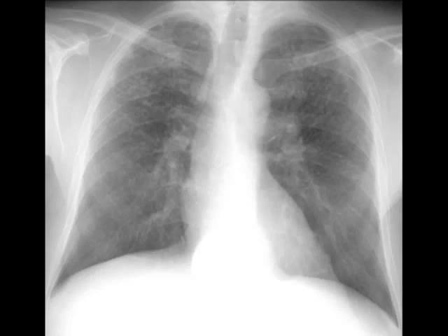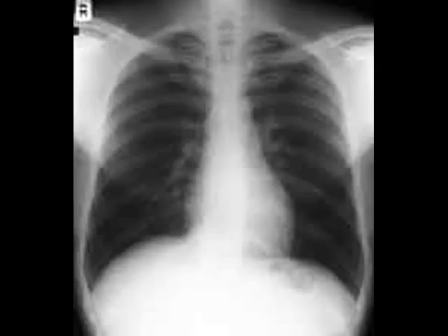The last indicator of quality is exposure. Now this is the hardest to illustrate and the hardest to see, but I'll do my best to explain it. Underexposure is an x-ray that doesn't reveal enough information. The x-ray appears too white because not enough energy was used to shoot the x-ray. There are calculations used by the x-ray technician to determine how much energy to use. In an overexposed or over-penetrated x-ray, you might lose the ability to see soft tissue structures, such as a tumor in the lung tissue.